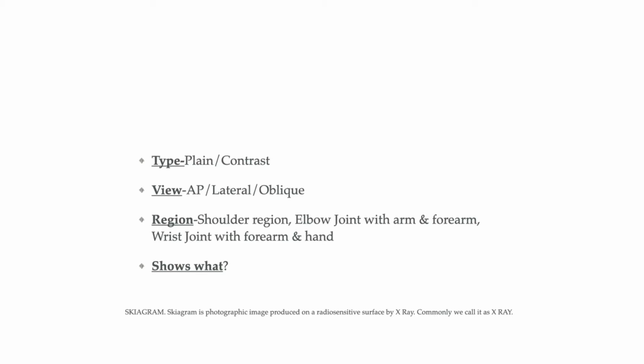Then the second thing you need to comment upon is the view, which means whether it is antero-posterior view, posterior-anterior view, lateral view or oblique view. View means in which direction the X-rays were projected on the body, from the anterior to the posterior side. This means the source of the X-ray beam.